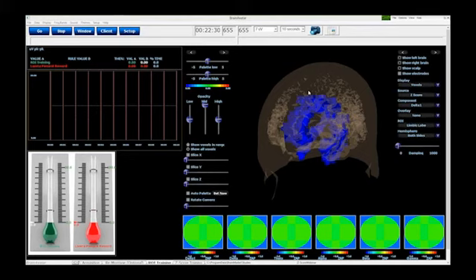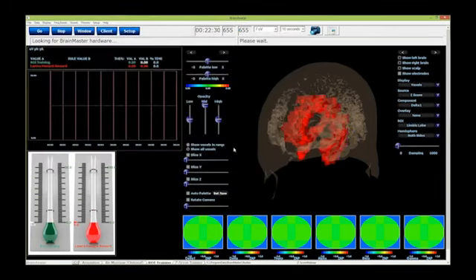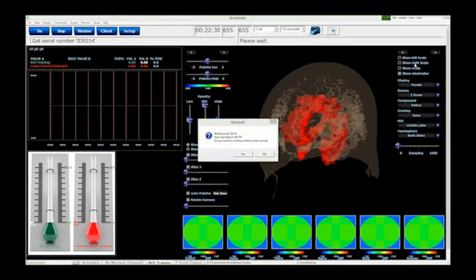So does that make sense? Did I get that across for you? Okay, well, let's have a look real quick at that. I did not know that that should have any effect on it, but let's just go right here. I'm going to go back into it. Make sure I'm in simulation. And I'm going to hit go, and I'm going to double check. That may have something to do with it. I didn't know of that to have an effect on it.